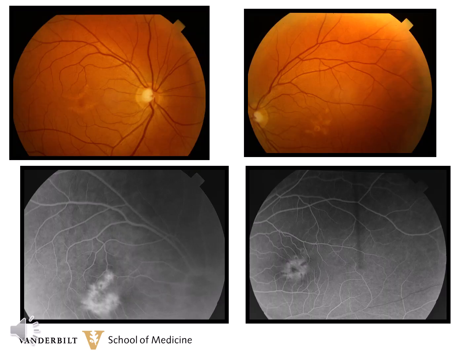This is a 44-year-old female who's had trouble reading for 6 months. The vision in the right eye is 20/20 and the left eye is 20/70. The color photographs show a radiating yellow butterfly pattern. It is fairly symmetrical, but just slightly different appearances in each eye. The fluorescein angiogram shows the areas of hyperfluorescence in the yellow areas and hypofluorescence wherever there is some pigment migration.